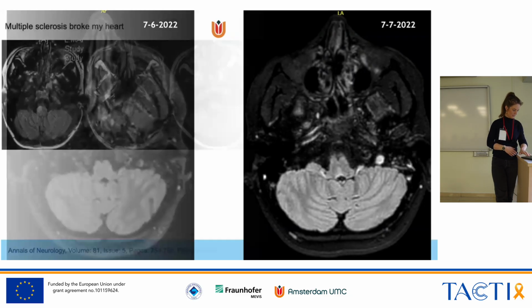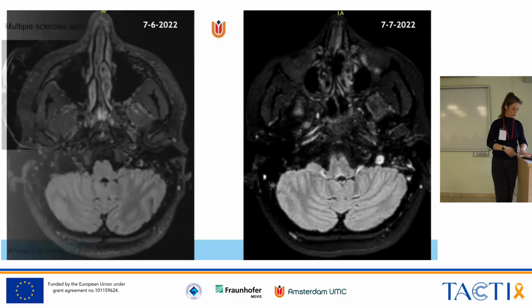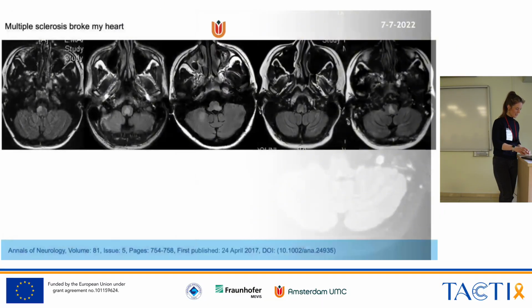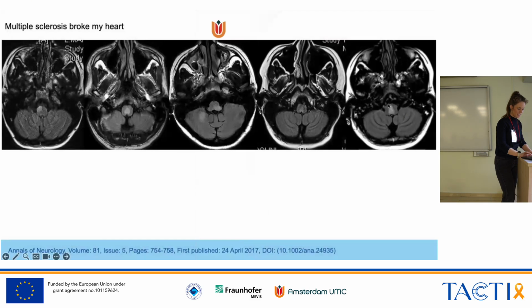Yeah. And I realized I only showed you one slice. It's always difficult, but here are some other examples. Same patient, right? Same scan time? No, different patients. Different patients, yeah.